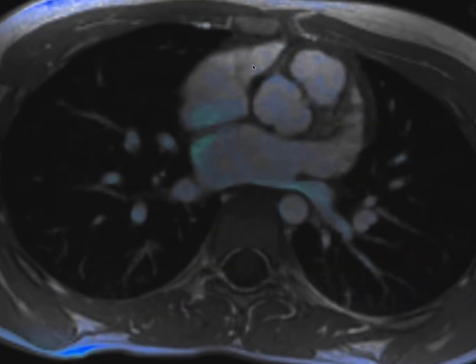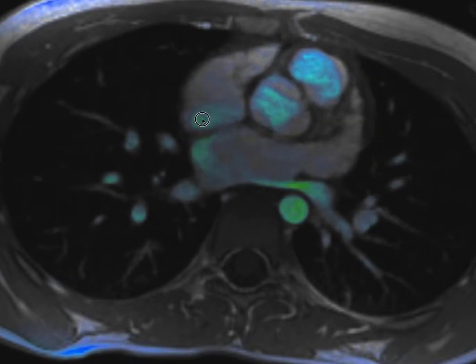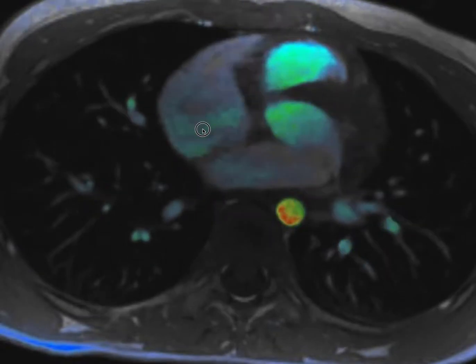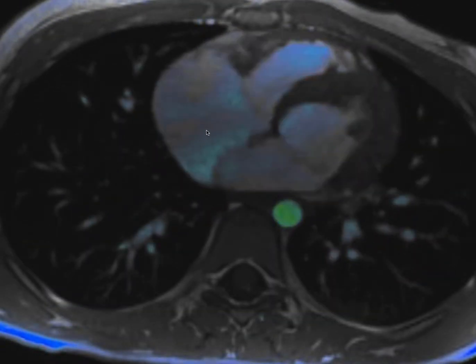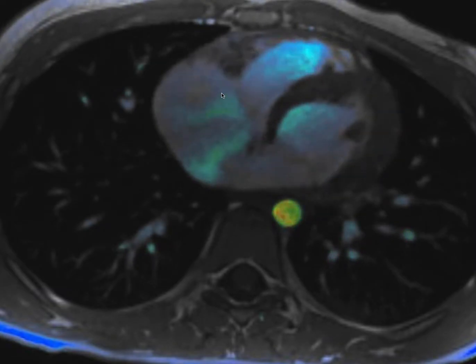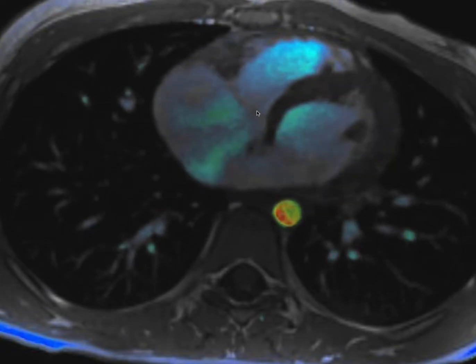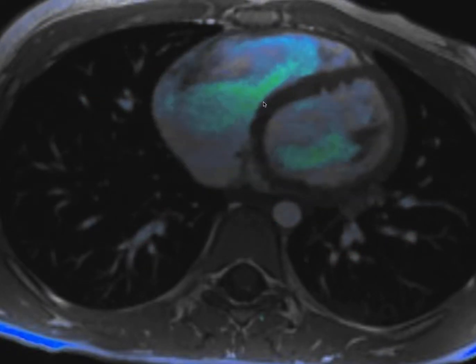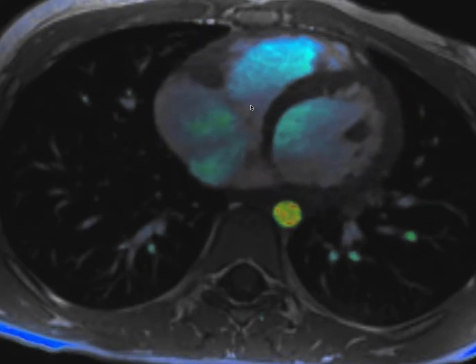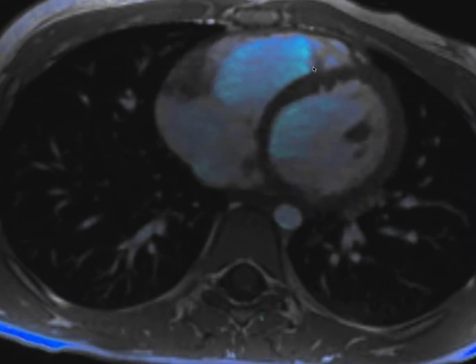Here you can see an atrial appendage anteriorly. This is the right atrial appendage. That's part of the right atrium. Now this right atrium then has blood drained through it, and it goes right into the right ventricle. You can see here also a valve. This is the tricuspid valve, and in this particular case there's a little bit of a leak of that valve, so it's a regurgitating or leaking valve. But in any case, here's the right ventricle.